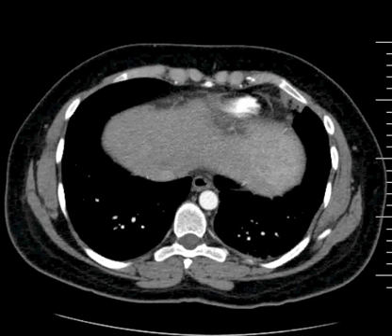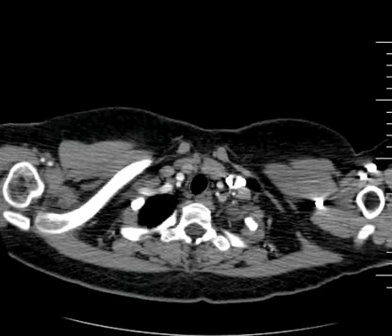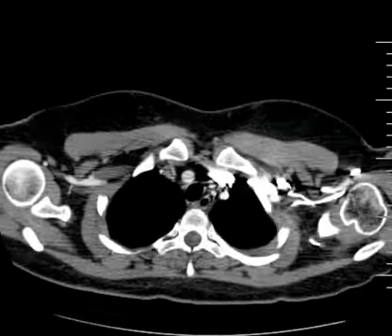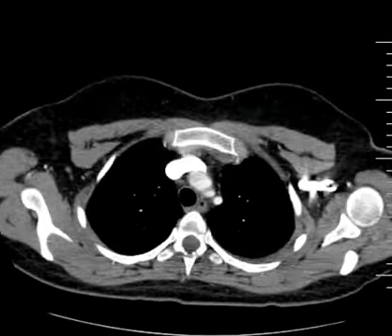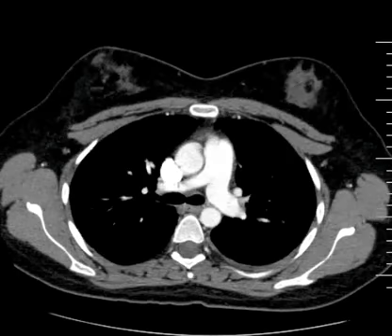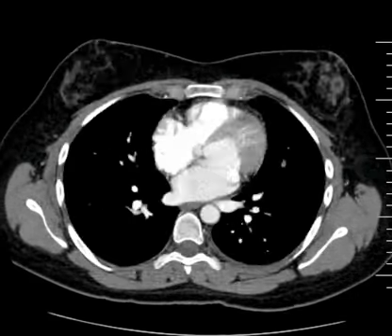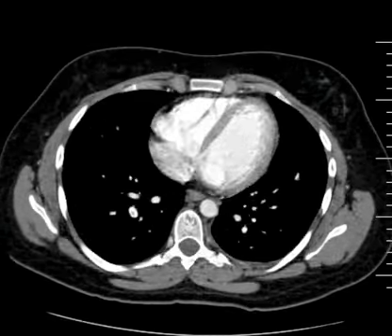Okay, I wanted to continue with one last case, which is, I think, of value because it's a little more difficult. It's not a big chunk of embolus in a main pulmonary artery. So follow this down. Here you can see we're in the arch. Now we're at the branch, or the main pulmonary artery, and it's branching, bifurcating under the aortic arch.